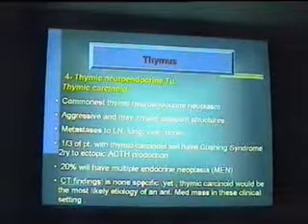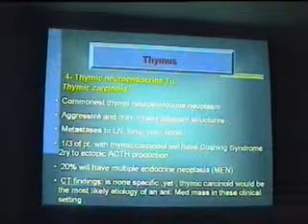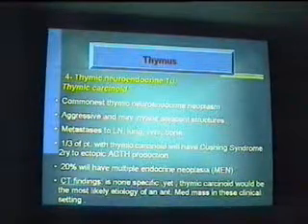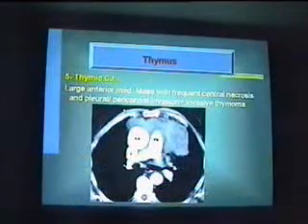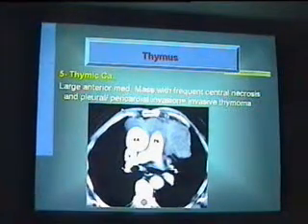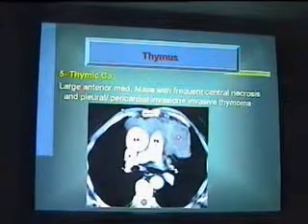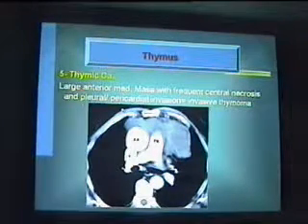الCT findings is not specific. ما عنديش حاجة تقول لي إن دي thymic carcinoid اللهم إلا إن العيان عنده ماس في الأنتيريور ميديستاين وعنده كوشنج مثلا. أوكي؟ then أقدر أقول إن this is most likely carcinoid. خلاص؟ نيجي بقى للfifth tumor of the thymus which is the thymic carcinoma. And this is a thymic carcinoma, a large anterior mediastinal mass sometimes with frequent areas of breaking down وبرضه تعمل لي pleural and pericardial invasion.